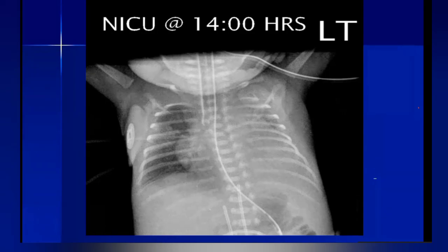That's why it's not responding to the therapy. If you concentrate, I know it's tough to see, but the left main bronchus is fine, and you can see even air bronchograms. Still, we need to know why this patient is responding only on one side, and the left is not responding here.